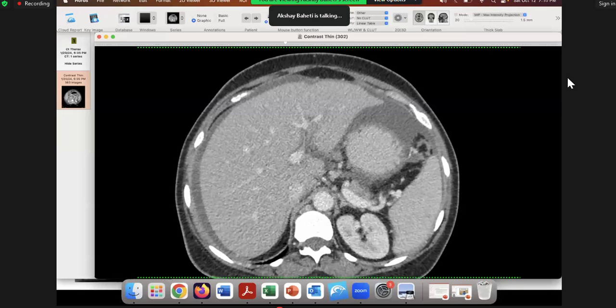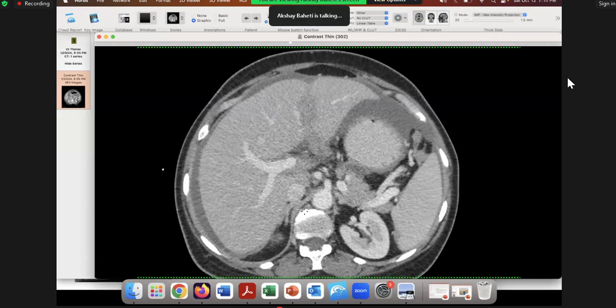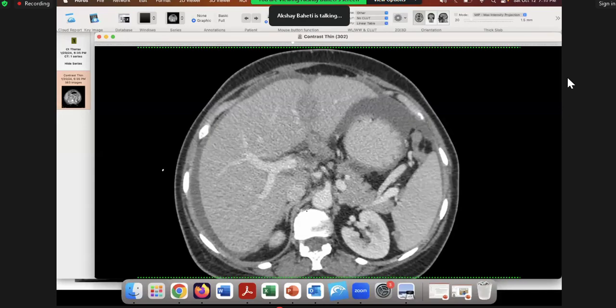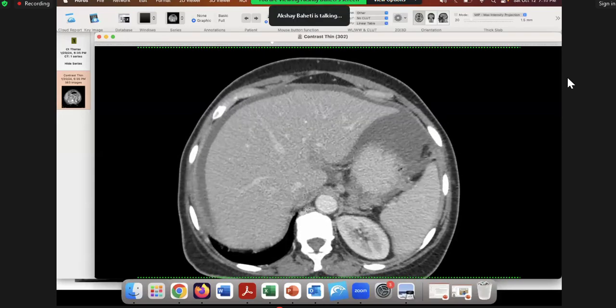Let's stop here. The para-aortic, yeah, retrocrural. Excellent. That's the word, retrocrural, right? So this is the crura and this is retrocrural. And again, you should just search for it. Okay, so remember, all cancers or all pathologies, you need to have a search pattern.